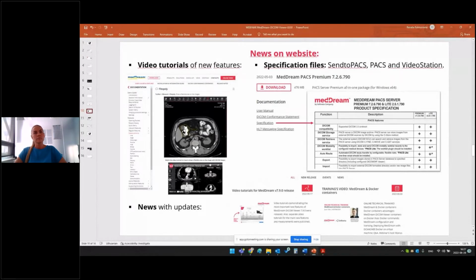As you see, we have the docs and API page, and it has the user guide and all the features. This is not the same as the user manual. This is a user guide, so as not to repeat the same information as in the user manual.